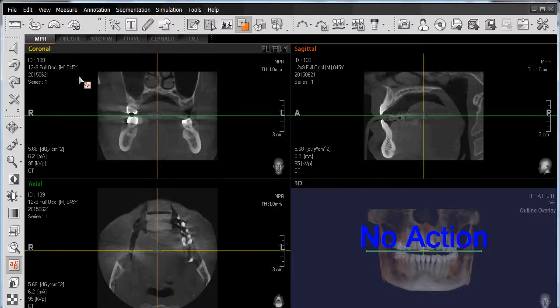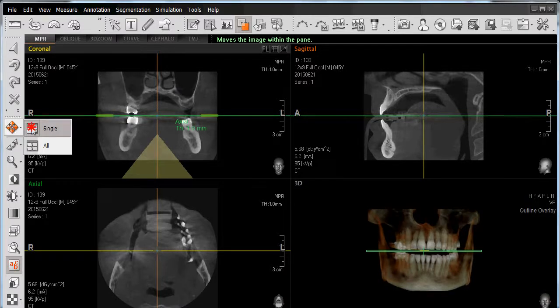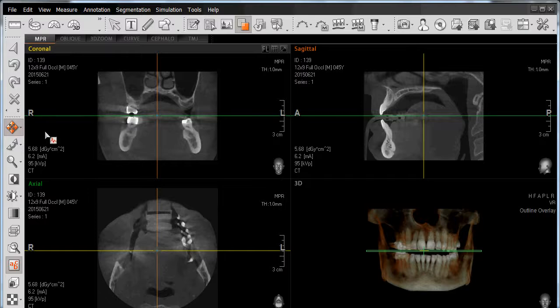To identify an active versus inactive function, simply left-click, and you note that particular function turns a dark gray as compared to the other functions themselves. To terminate a function can be performed in one of two ways.